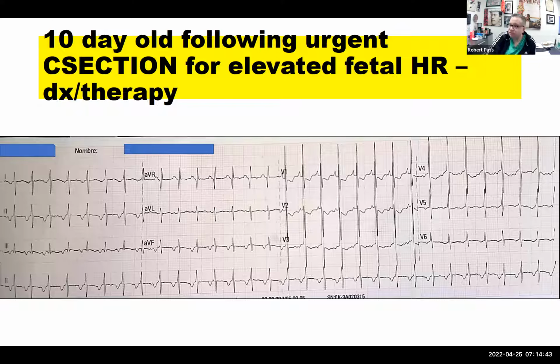Okay, so you call to the NICU about this patient. They are in tachycardia, although not very fast. And as Sergey correctly said, this heart rate of 170 is not especially worrisome in the short term. But Grace, what would you recommend if the NICU is asking you, they're saying that the heart rate is pretty much sticking around 165 to 175, and this is the rhythm most of the time. Does this need to be treated? And if so, how would you treat it?